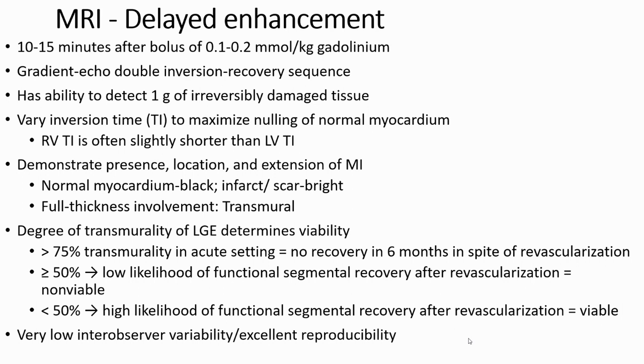Vary the inversion time to maximize nulling of normal myocardium; the right ventricle TI is often slightly shorter than the left ventricle TI. It demonstrates the presence, location and extension of MI. The degree of transmurality of late gadolinium enhancement determines viability. It has very low inter-observer variability and excellent reproducibility.